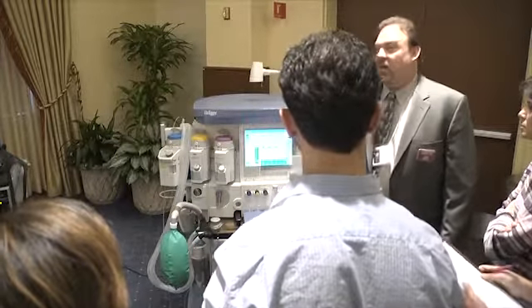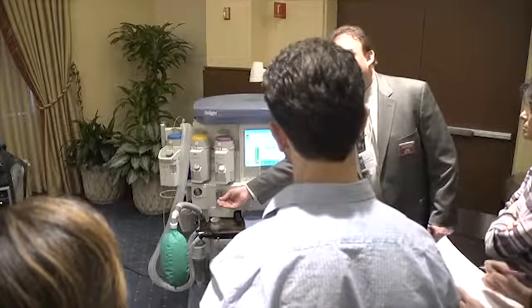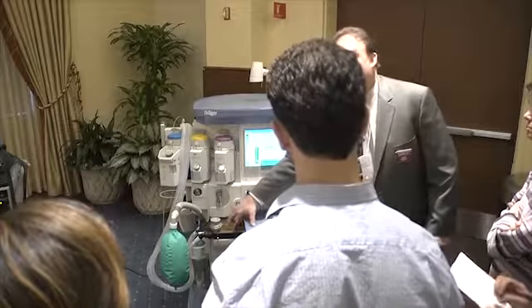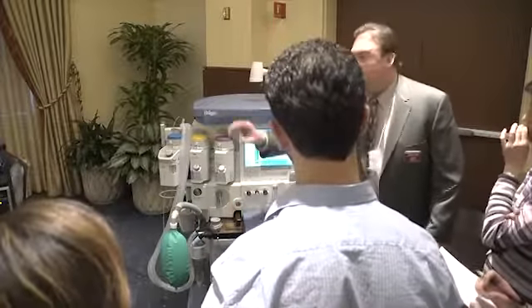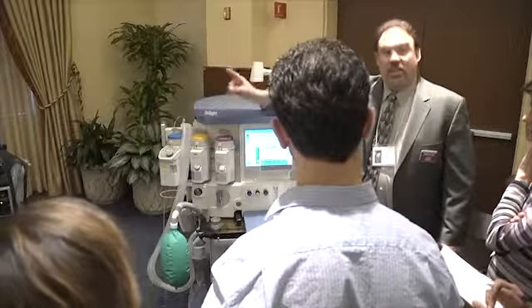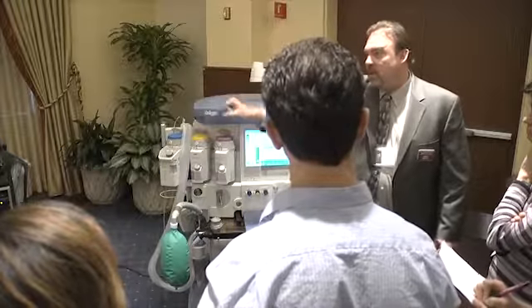The other difference in this type of anesthesia machine, especially the Apollo, is that it takes a sample of gas for analysis for CO2 and agent. That's about a 200 cc drop. It samples it, reads it, displays it, but then it puts that back into the breathing system. On that machine, there's a separate gas analyzer. It samples that 200 cc's, but it takes it to the scavenger afterwards. So we're losing 200 cc's there as well.